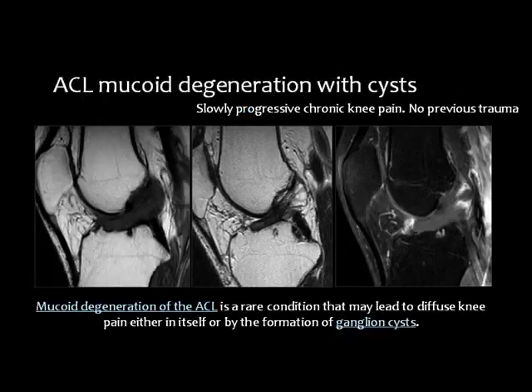Then, what do you think of this ligament? This is mucoid degeneration. The ligament is swollen and there are some fibers going inside the ligament. Okay, this is mucoid degeneration.